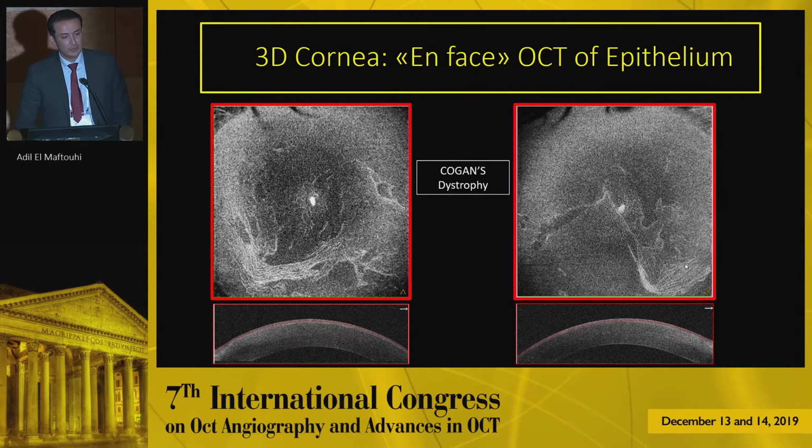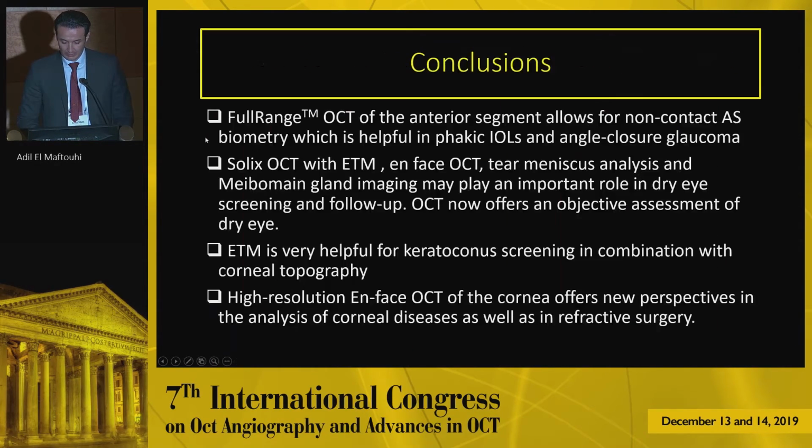Cogan dystrophy is the most common disease after 15 years old, and with en-face OCT, you can easily make a diagnosis of Cogan dystrophy with specific folds of the basal epithelial membrane.